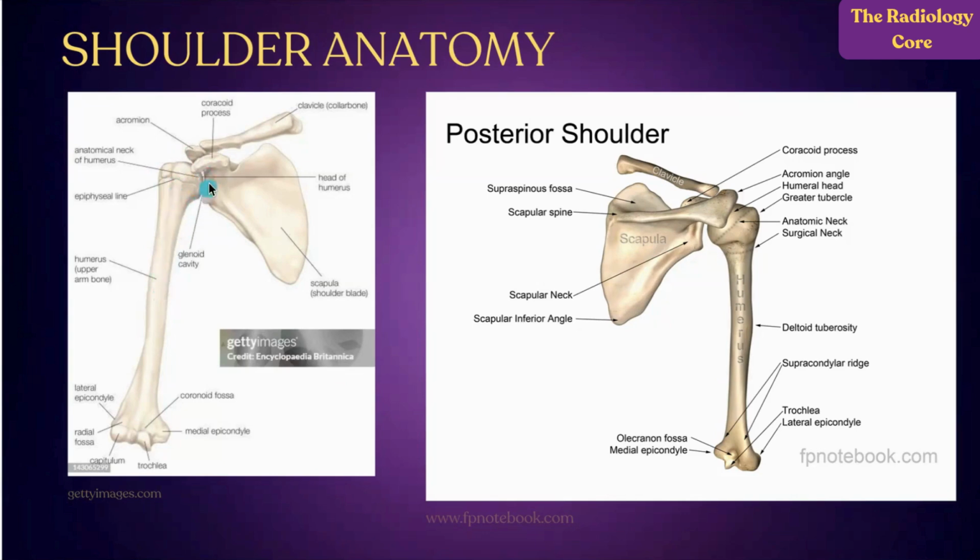You're going to see the glenoid cavity seen here, and then also here posteriorly. The scapular spine and the scapular neck are seen from the posterior view. Again, you'll see the superior angle and the inferior angle of the scapula from the posterior aspect as well. Again, the glenoid cavity here, and then this portion here is the posterior view of the clavicle. The acromion seen here forms the AC joint, the acromioclavicular, and then on this side, that's where the sternum will be found anteriorly.